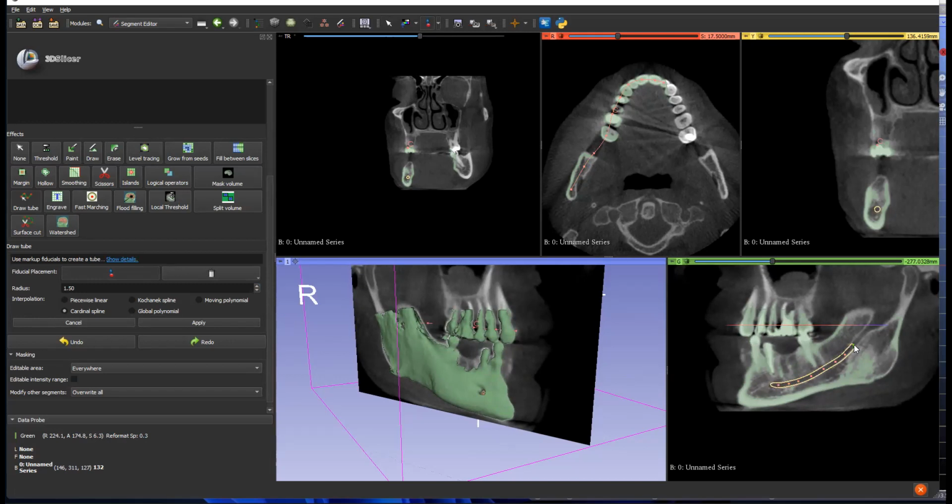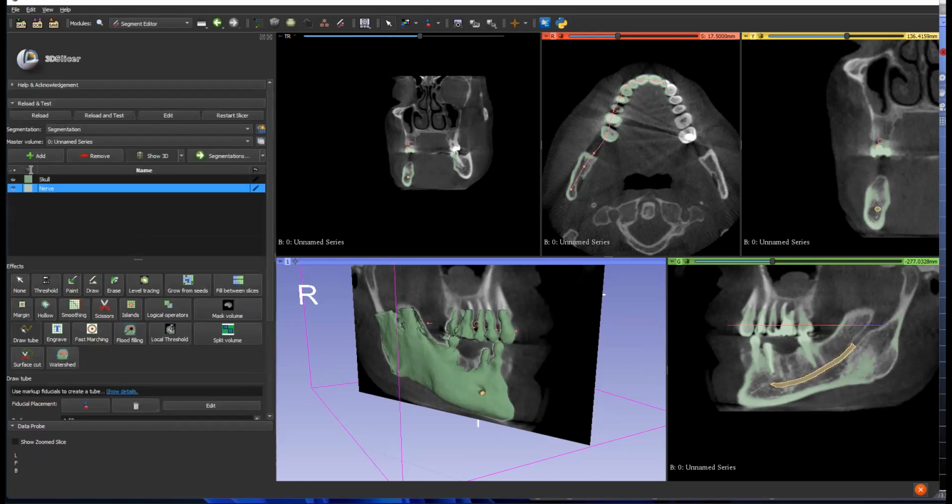We don't have to take it all the way up because our implant site is over here. But it's very visible if you've got the slice correctly aligned. Then what we need to do is we're going to apply that, which will then solidify it and make a model. Now you can change the colors, but there's no need to do that at this stage. So now these two models we need in Blender. So once you understand how this works, you're like halfway there in the digital planning.